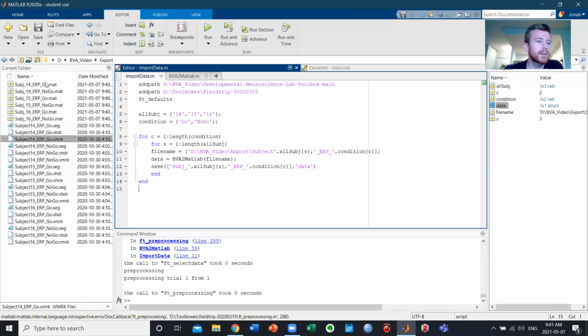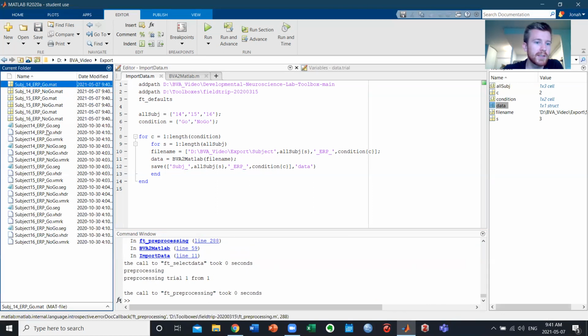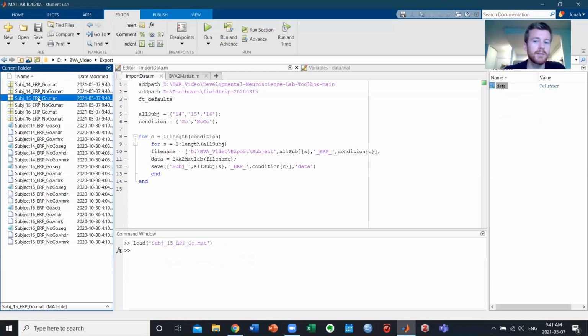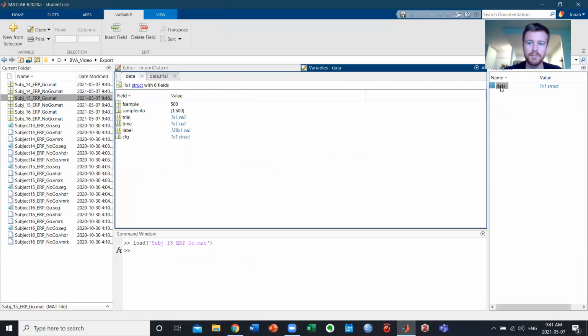All right, so that worked. We've got 1, 2, 3, 4, 5, 6 subjects here. This is all of our ERPs. So I'm going to go ahead and open one up, this guy. And yep, there's our data. Awesome. So this is everything we need.